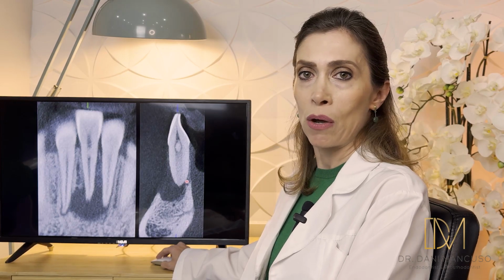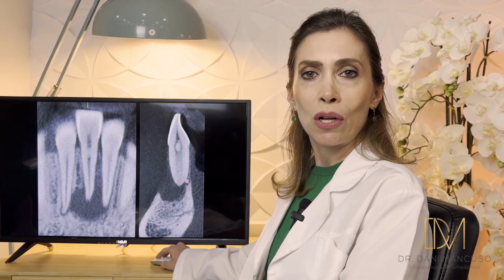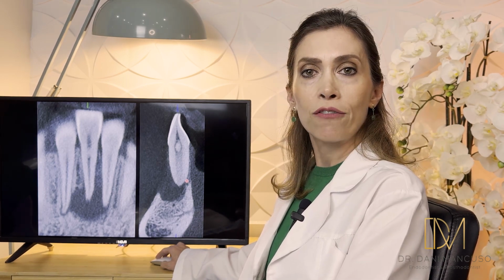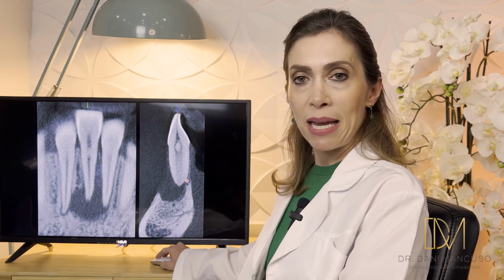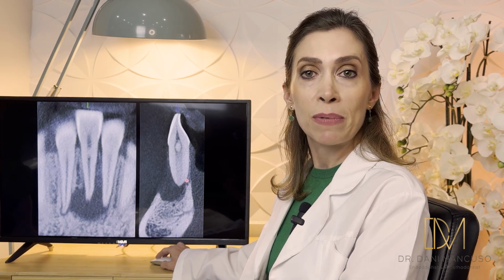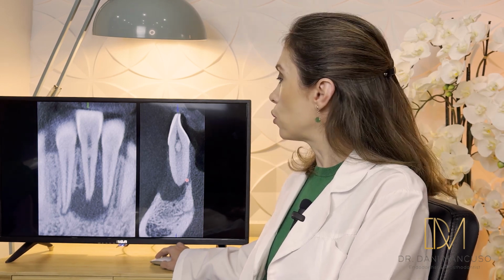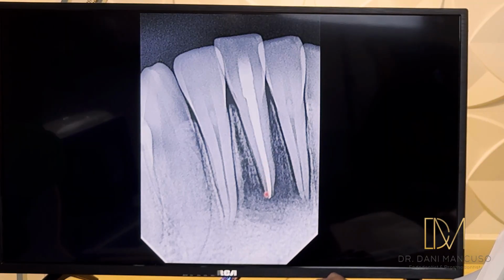Don't be scared of those radiolucencies. If it's not a true cyst, it's going to heal after root canal treatment. In some cases where there is a true cyst, or if it's quite tricky, then an apicectomy or endodontic microsurgery may be advised. But in this case, we could do the root canal treatment without any problem, and I could remove that calcification. There are calcifications as well on the other teeth, so it could be quite normal for that patient, so don't worry too much.